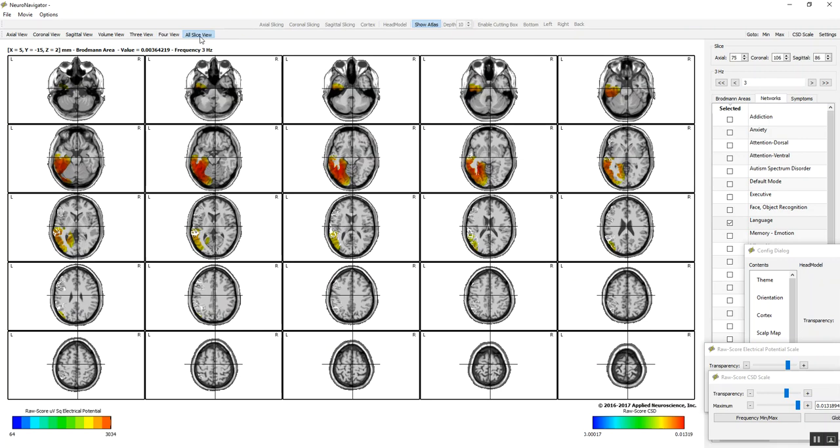You can also, of course, evaluate all the slices, which shows you the depth of this event. You can see the epileptic discharges are quite deep, but not superficial. By the time you get to this coordinate system here, there's no epileptic discharge. It's primarily in the lower slices, and here's the Talairach atlas coordinate and the Brodmann areas as you navigate through this space.